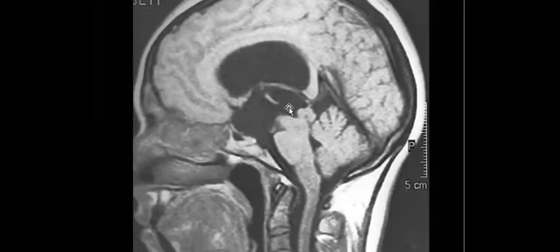Okay. Just to mention that the tectum, you should check for the tectum if there is any tumor like tectal glioma. Yes, perfect. So maybe aqueductal stenosis, maybe tectal glioma as well. Okay. And I agree with you.